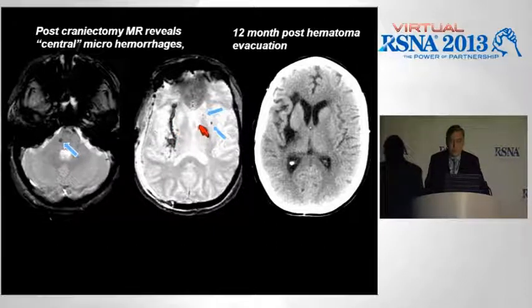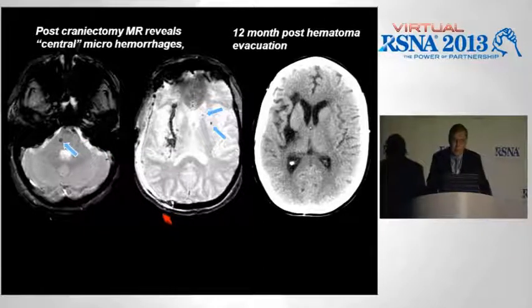If you look closely, you can see some areas of microhemorrhage, and microhemorrhages are a finding that can be seen centrally in patients with hypertension. These types of hematomas tend to dissect along the white matter, and so even though this patient had a very massive hemorrhage, the patient has undergone rehabilitation and is actually recovering quite nicely because you can see much of the overlying cortex is intact.